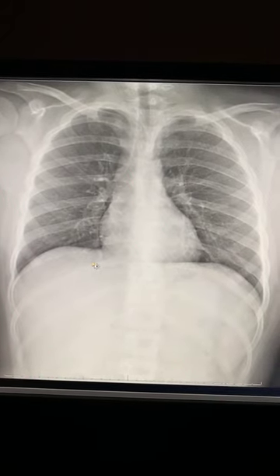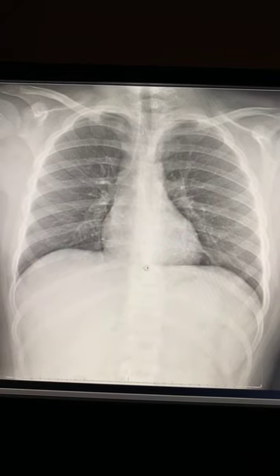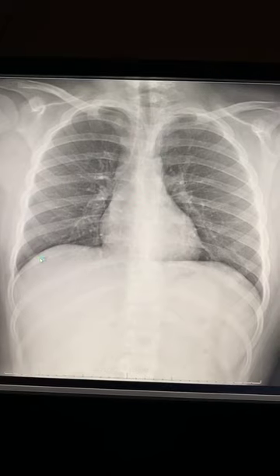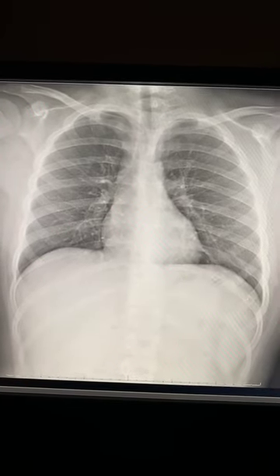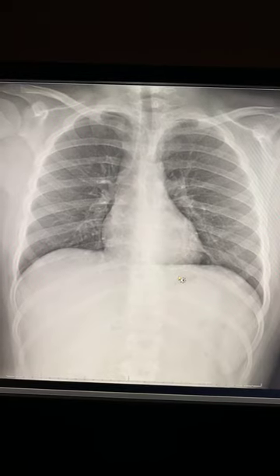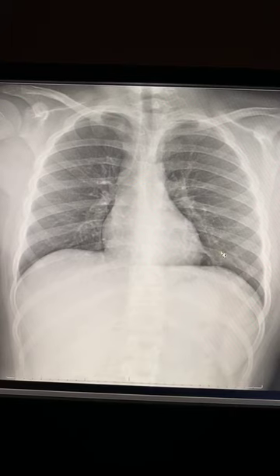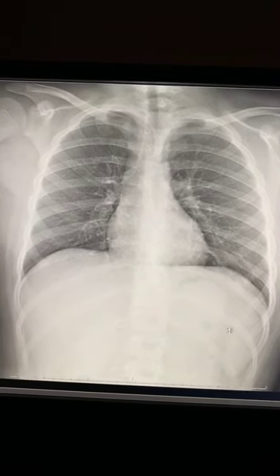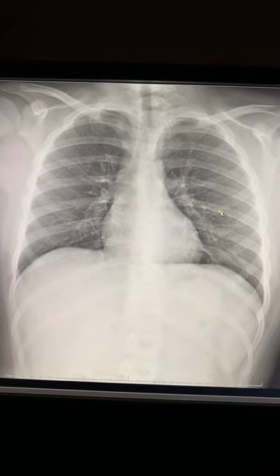I mean, you're looking at a normal chest x-ray right now, so this is what it's supposed to look like. Look at the right hemidiaphragm and then look at the left. This should be higher in, I'm making up a number now, 92% of your patients, okay? If the left side were higher, it's your job now to figure out why, all right? Is the lung collapsed? Is there loss of volume on this side and therefore it's being raised up? Or is there increased volume down here and it's being pushed up? So it's your job to figure out why.